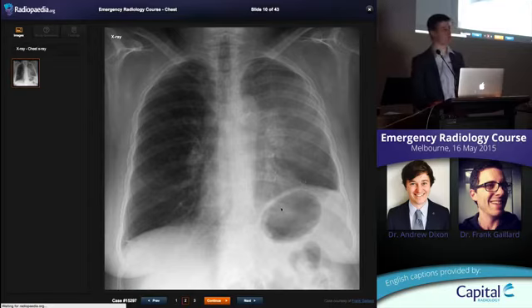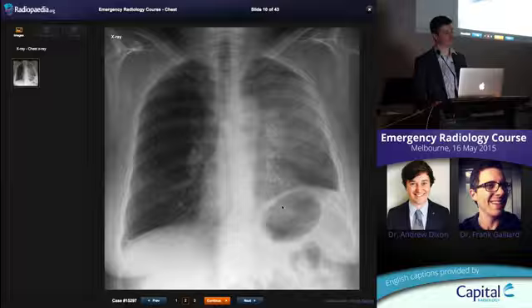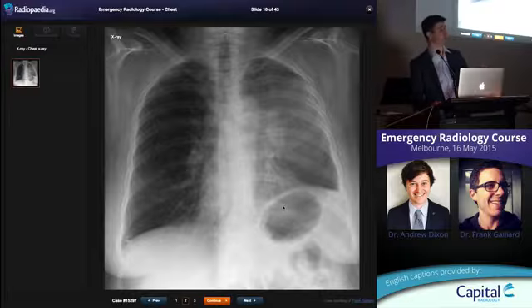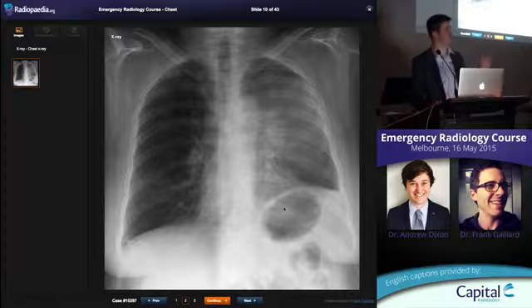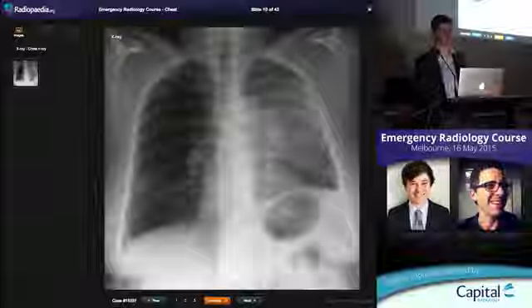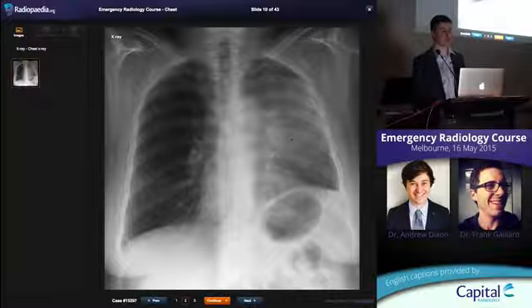Okay, shortness of breath in an elderly female patient. This is probably the hardest of the lobar collapses to identify. This is a left upper lobe collapse, and the left upper lobe collapses anteriorly in the chest. It spans right from the base of the lung all the way up to the top. So when it falls against the front of the chest, it just creates this generally increased density throughout the whole of the left hemithorax.